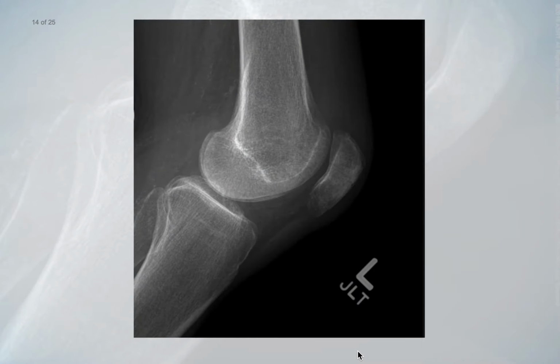The following quality criteria are used to determine if a lateral patella radiograph has been produced with proper positioning and technical factors. Collimation does not obscure relevant anatomy. The patella is seen in lateral profile. There is correct 5 to 10 degree flexion of the knee, and the joint space between the patella and femur is open. There is adequate demonstration of soft tissue and bony trabecular detail.